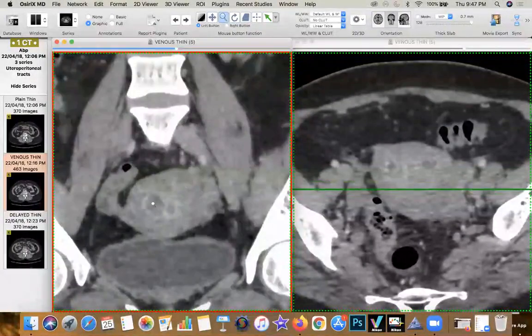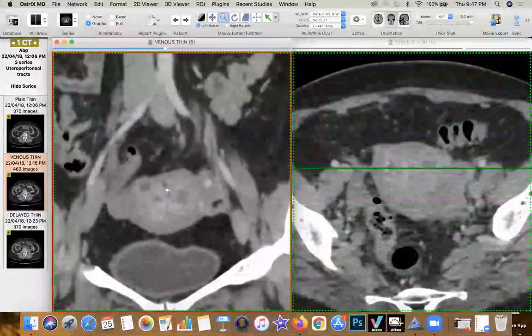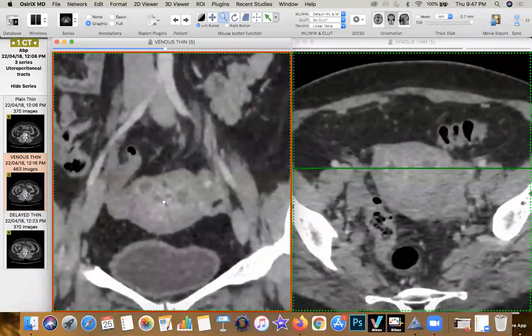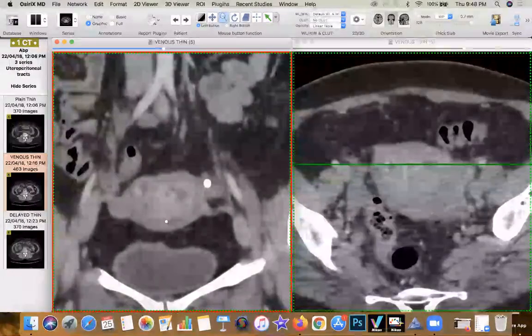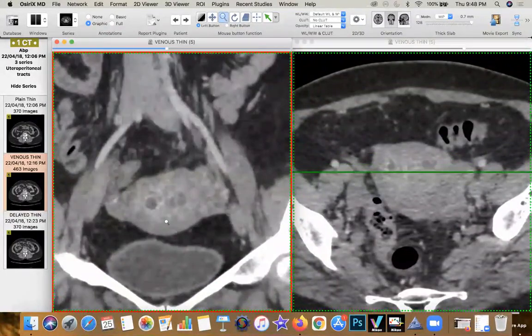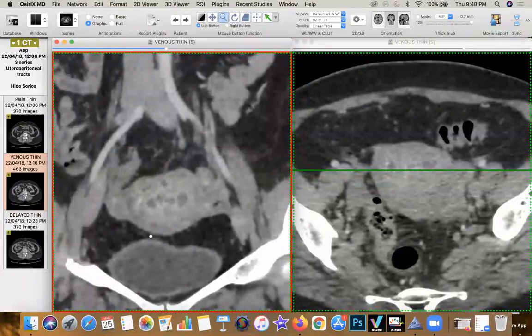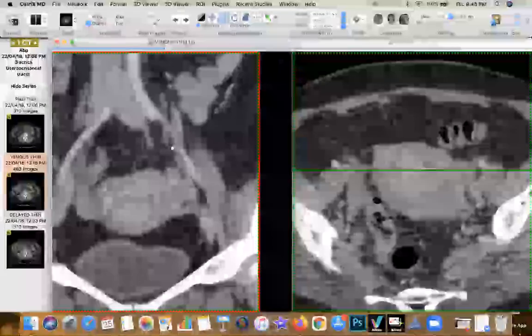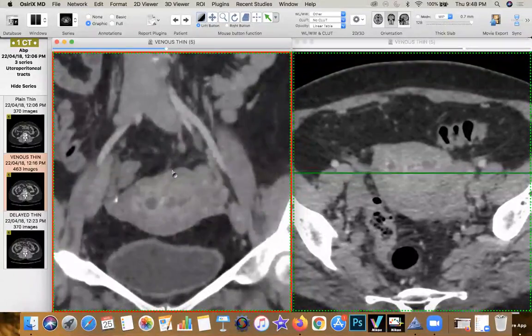You can see that there are these lesions coming up, which are radiating outwardly from the cavity, and they're going either into the posterior or the posterolateral myometrium, and they're reaching up to the serosal surface of the uterus itself. Now, this is what you get to see. And then from the serosal surface, as compared to the supravesical fat here, the fat plane posterior to the corpus is very, very fuzzy. Look at this.